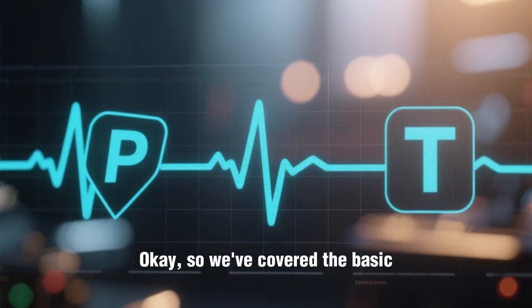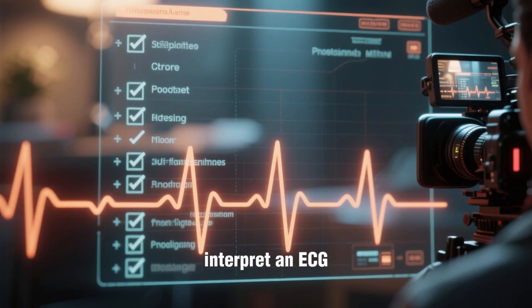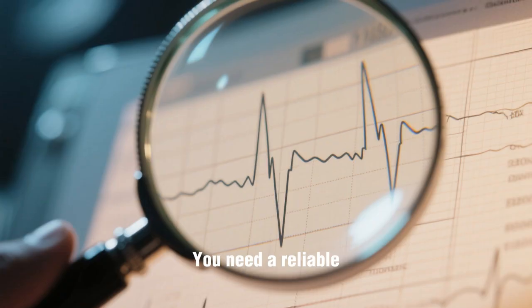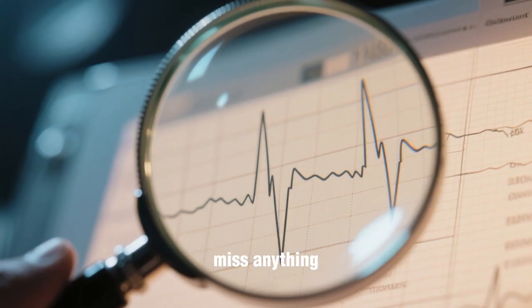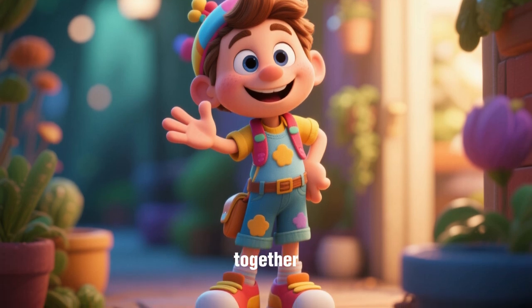Okay, so we've covered the basic building blocks. Now, how do you put it all together to interpret an ECG systematically? You need a reliable method so you don't miss anything. Here's a simple, effective approach. Let's go through it together.